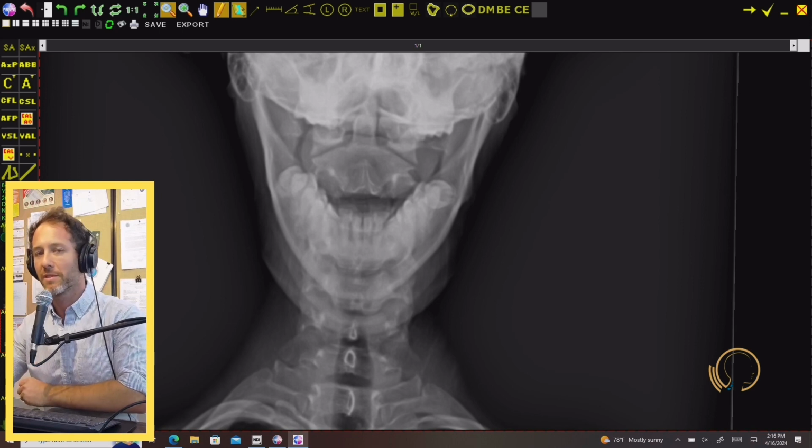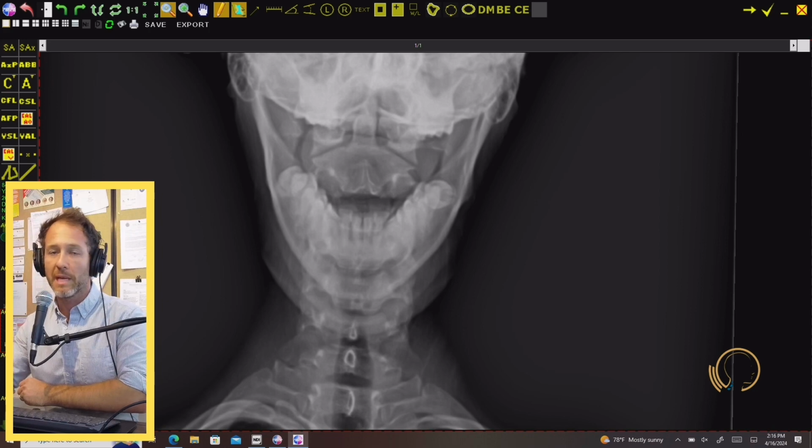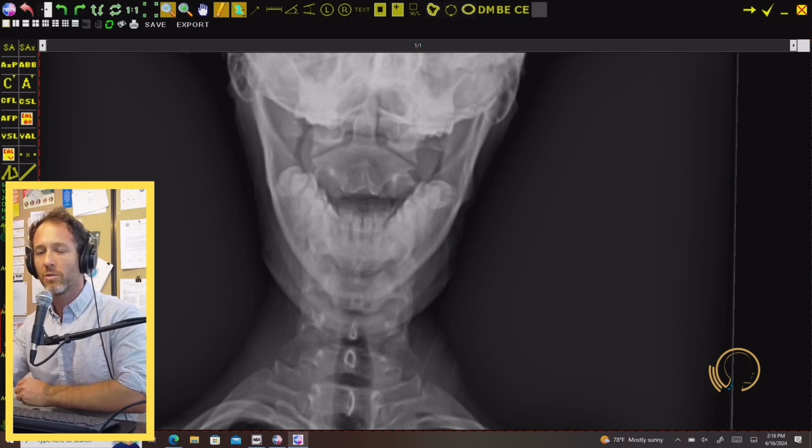So my goal is to get through these different views in terms of analysis and then maybe move on to table placement. We'll see. You guys can let me know. But the axial view. Again, this is one of those where it's easy to overlook. You're breezing quick. It doesn't seem as interesting as a frontal view, but I'm telling you, this one has huge implications for how your patient gets adjusted.